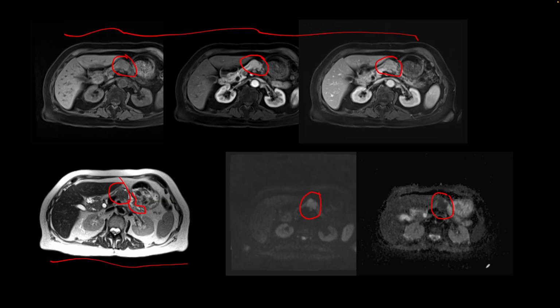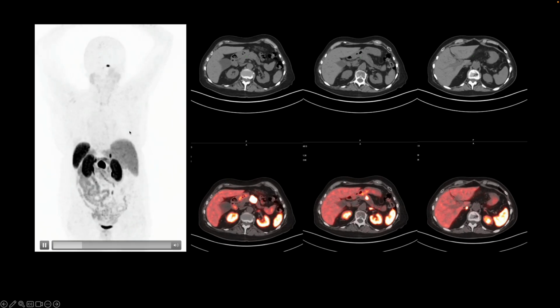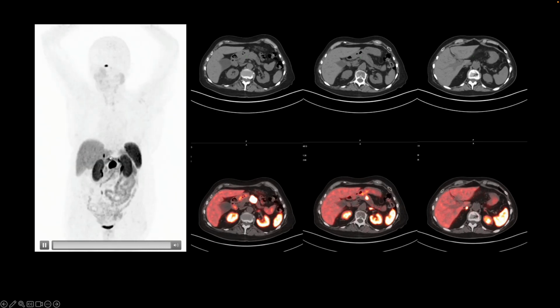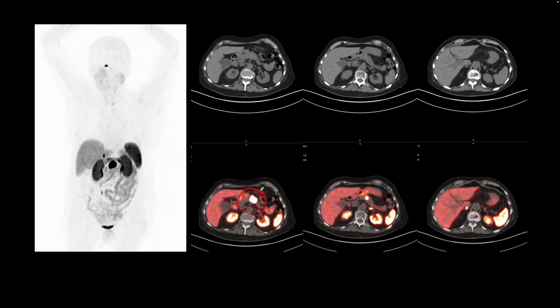So this patient would need a DOTATATE PET CT for whole body staging, and here are the images from that scan. We will start by looking at the rotating image where we see this physiologic uptake in the pituitary, we see focal intense uptake in the tumor, and then we see physiologic increased uptake in the adrenals. So let me show you those findings on the cross-sectional images. This is the tumor with intense uptake of DOTATATE. Then we have physiologic uptake in the left adrenal and physiologic uptake in the right adrenal, which should not be confused with a tumor.